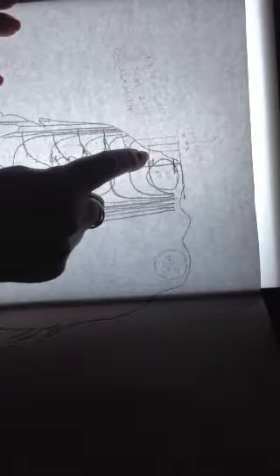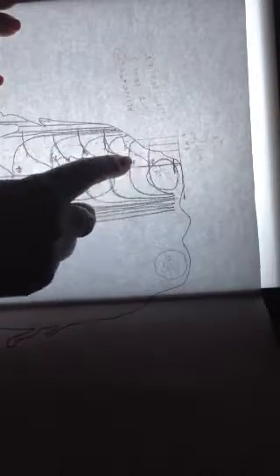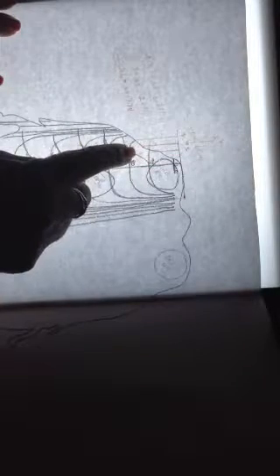So along the grid lines then, that I put the dashed line down, I'm going to measure from the old isodose line down. For example, for segment number 1, the 90% isodose line, I should measure from here down 0.871, and I put a tick mark there. For the 80% isodose line, from here down, and put a tick mark there.